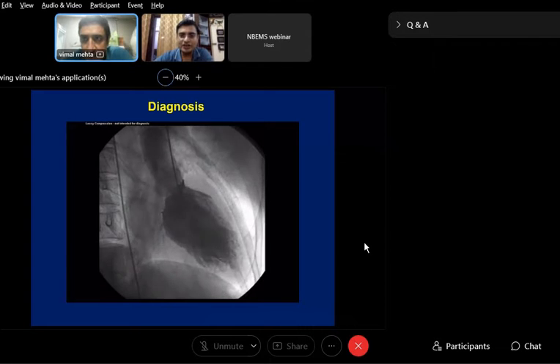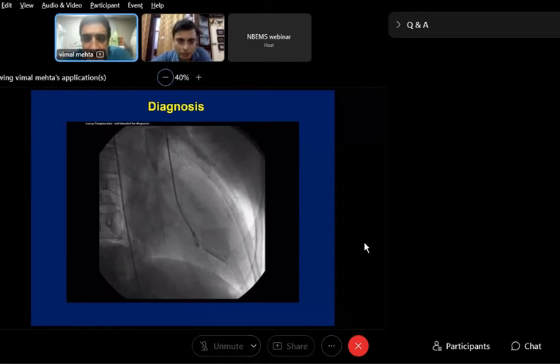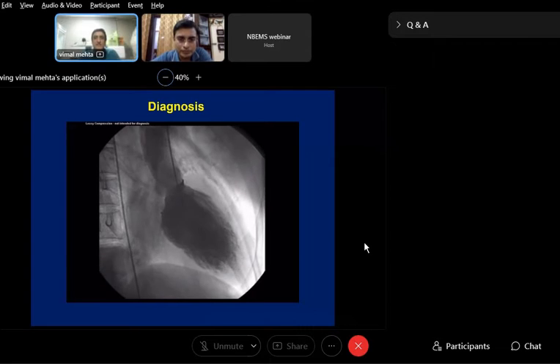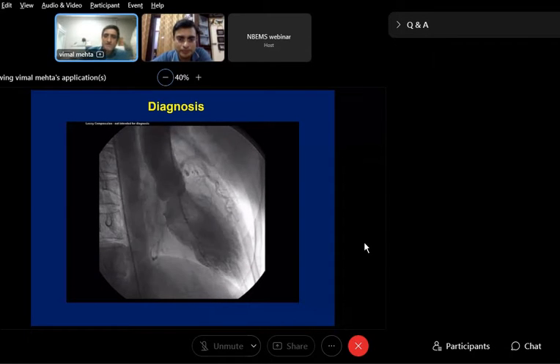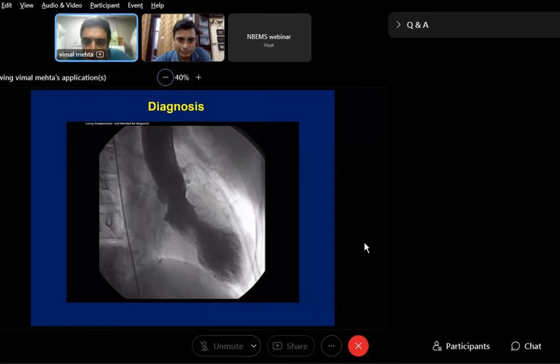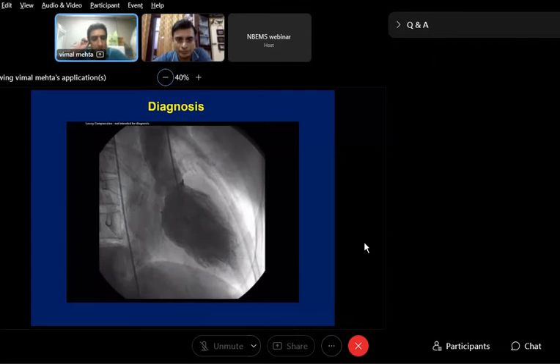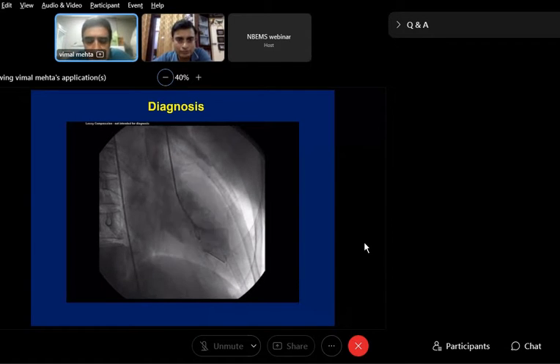Okay, angio is normal. Very good. And more importantly, as you will see, thickness. In the initial phase, thickness will be preserved. Once the infarction has occurred, until a scar is formed, thickness will be preserved. The more correct answer is for the examiner's satisfaction. Here you can write anything, I don't mind.